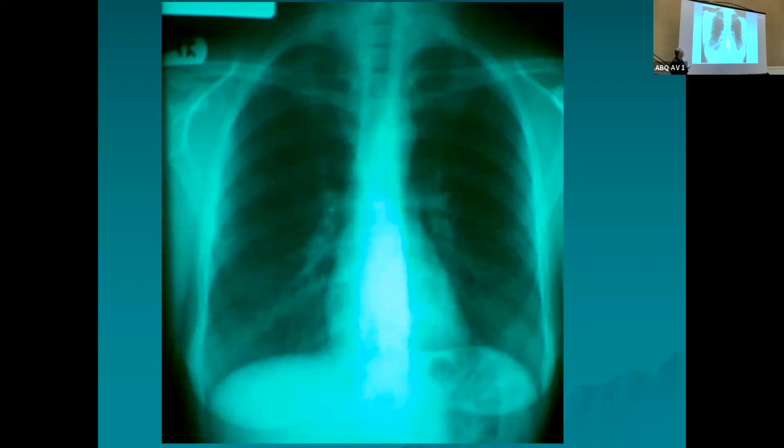So you got some tissue buildup right through here that makes it look like that's actually pathology. And looking right through here, it does streak down here. That's not really infectious process. When I was first starting off with x-rays, I'd look at that and think, oh boy, they've got pneumonia right there. And they'd say, no, that's not pneumonia. Kind of that buildup that's normal, that tissue that's present right through there.